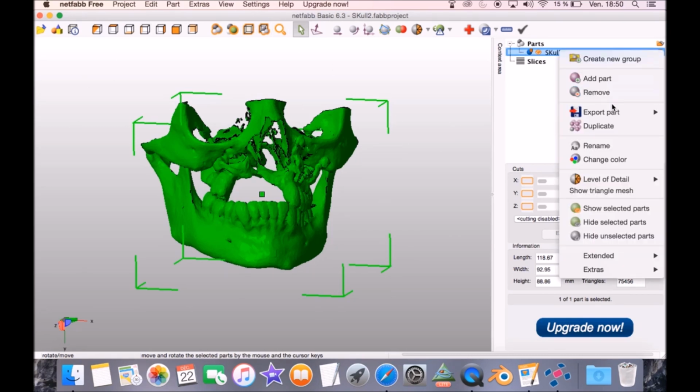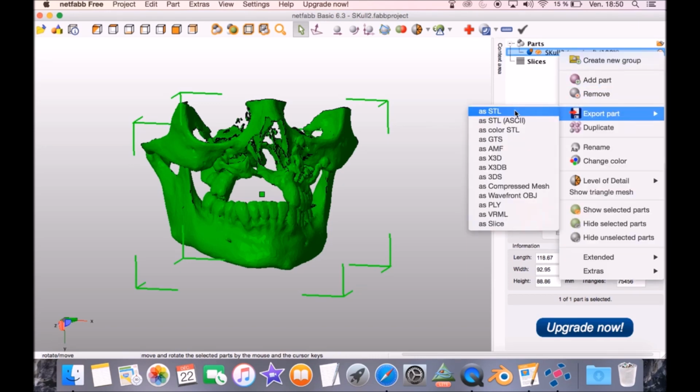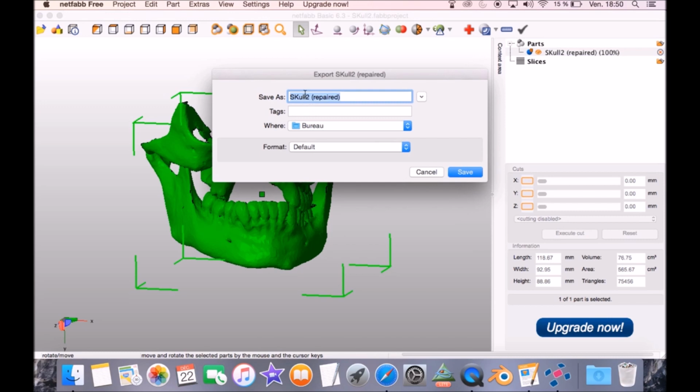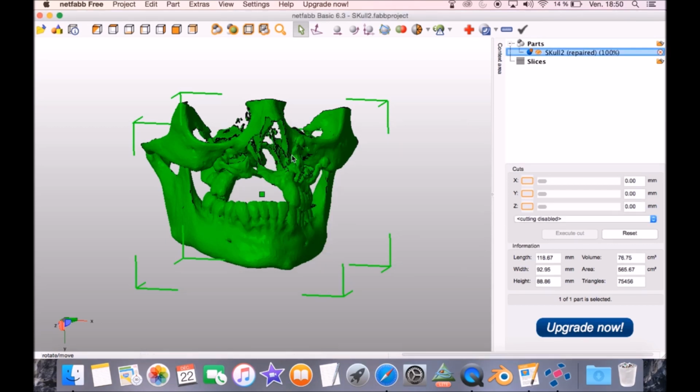And now, even if there is still the alarm in the lower right corner, don't be afraid. You just export. You see, we still have 100 and something edges that were changed. You obviously optimize your object, and that is the export.